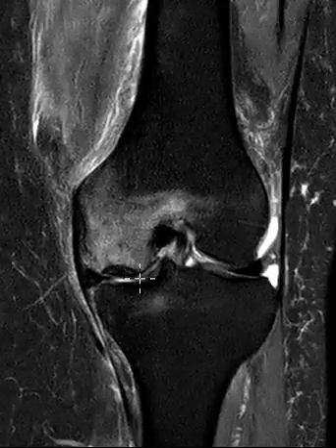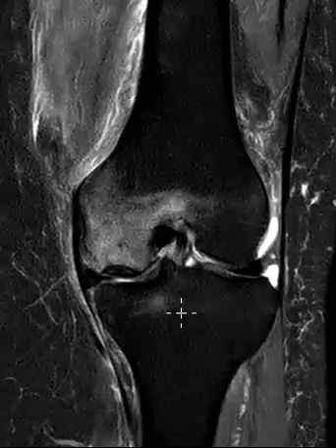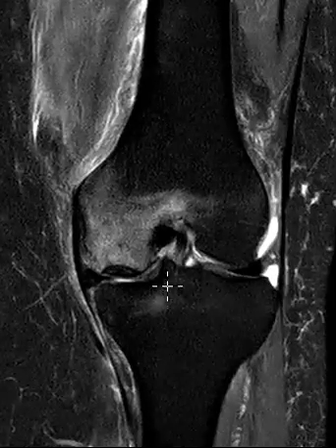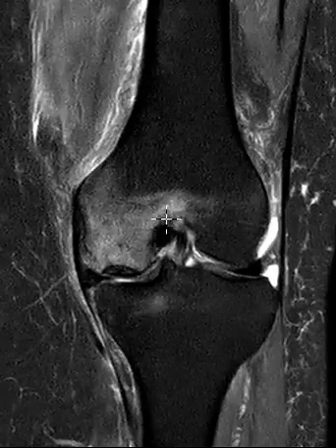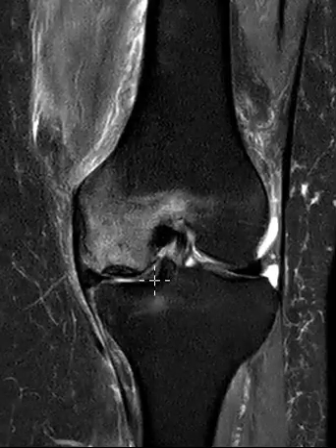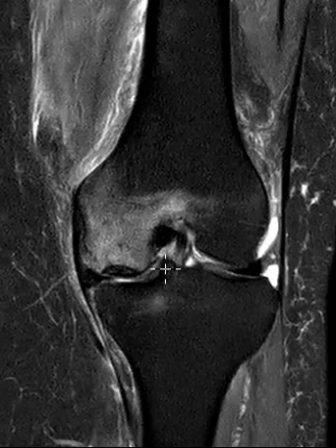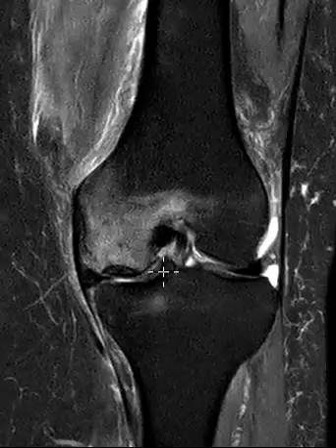We also see a band of darkness underneath the articular surface. So just in this one view here, again, since it's one of those patterns you recognize over and over again, this typically is related to a tear of a meniscus. Usually it's in the back of the meniscus on the medial side, in the root in the back, or the posterior horn root junction, and the meniscus gets torn.